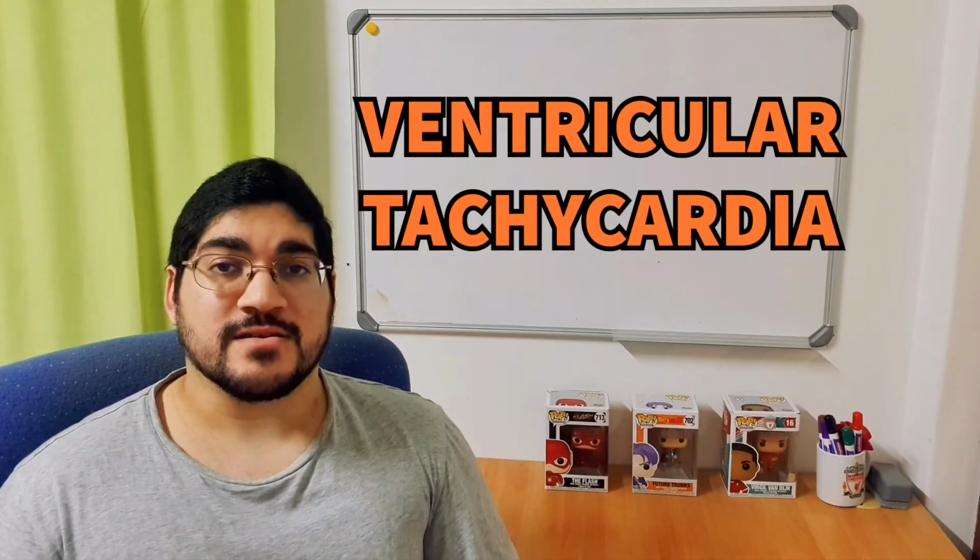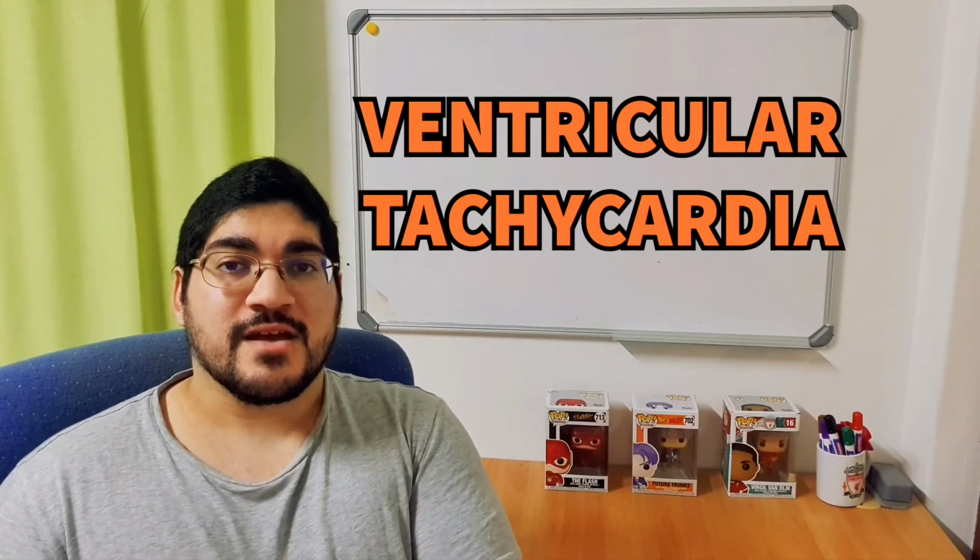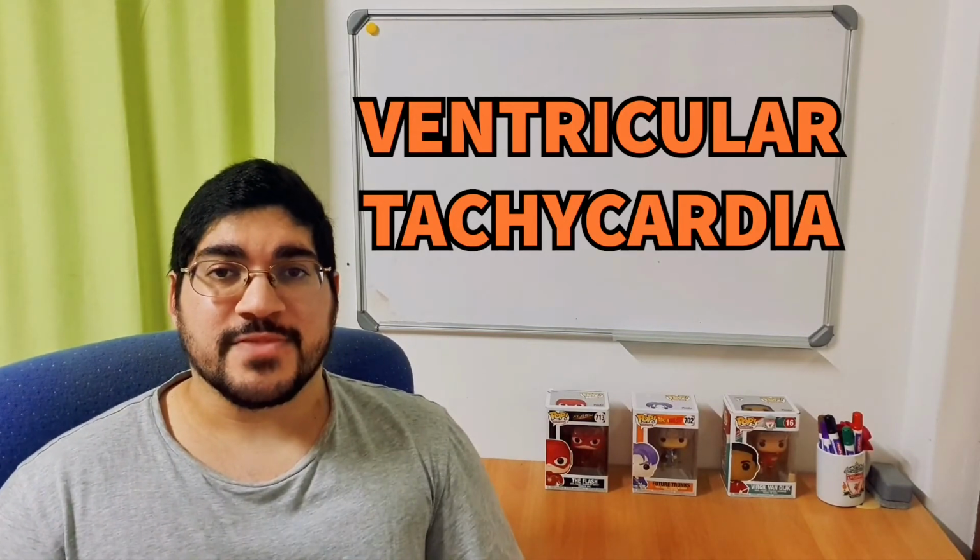Now we're going to be talking about the ventricular tachycardias. We spoke about the supraventricular tachycardias, or the narrow complex tachycardias. Now we're talking about the ventricular tachycardias. We're starting off with the wide complex regular tachycardias. So regular ventricular tachycardias, of which the first one is ventricular tachycardia. So just simple VTach. And if you see VTach on an ECG, the first thing you need to do is defibrillate. That's what VTach requires. It's a shockable rhythm in CPR. You need to defibrillate that patient.